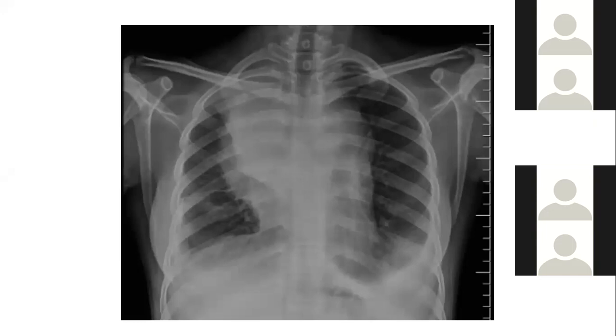First thing that we have to say whenever we see a lesion is whether it is parenchymal or mediastinal or extrapulmonary. Mediastinal, pleural, it can be anything. In this case, we are thinking of a mediastinal versus pulmonary. So again, there is a broad base. In fact, there are two margins here, right? There are two margins and both are having broad base and obtuse angle towards the mediastinum.